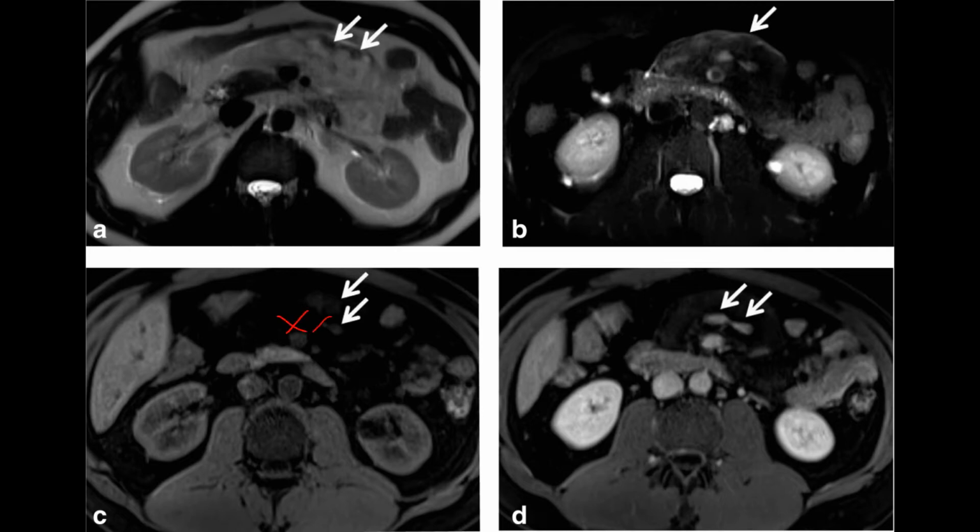No. In the contrast enhanced image, there is no mass effect, and no mass lesion enhancing there. So what is it suggesting? It is just suggesting that there is some edema. Edema of fat is nothing but panniculitis seen in mesenteric fat, so mesenteric panniculitis is the diagnosis. It is an inflammatory condition, so we have these enhancing lymph nodes.